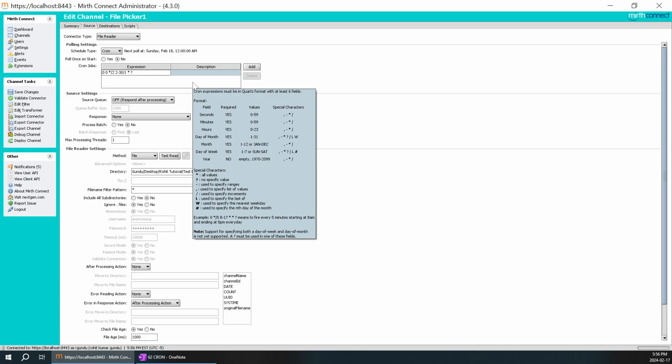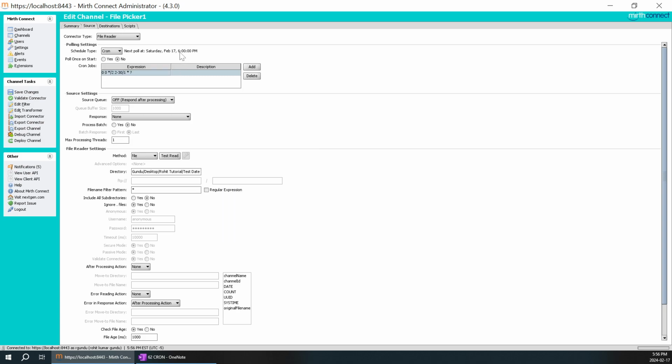I will change this number to 1. You can see February 17th, 6 p.m. So it's taking the current time. After 6 p.m., it will take another 2 hours and will take 8 p.m. So it's changing to odd numbers.